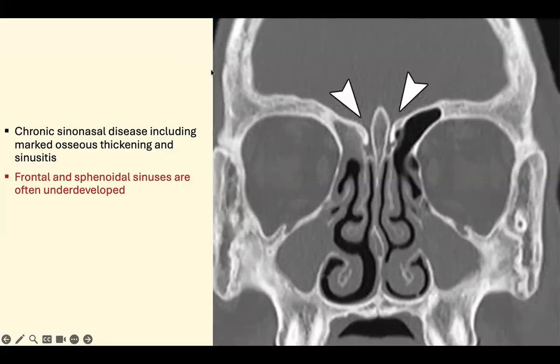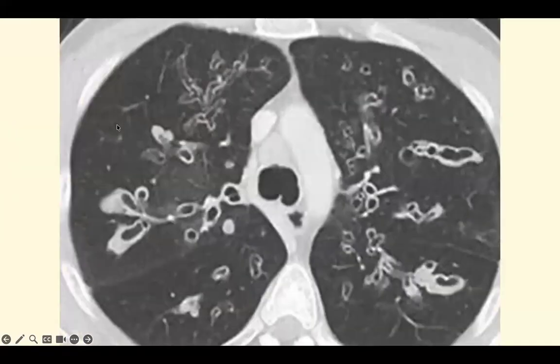That's why we should use the term bronchiectasis with caution. Let me show you an example. This is bronchiectasis. This is not bronchial wall thickening because here there is loss of tapering. This is distortion of the bronchi. Peribronchial thickening will not affect the bronchus tapering to the distal portion of the lung, and with treatment, it can be reversible.